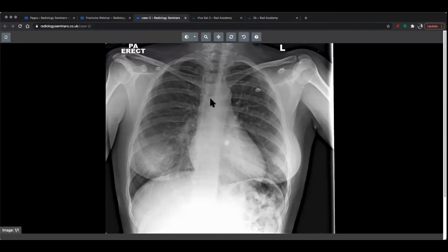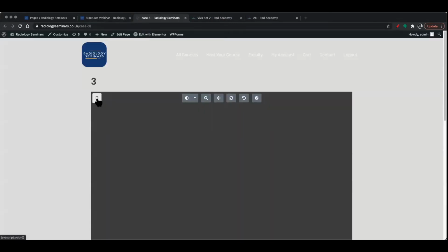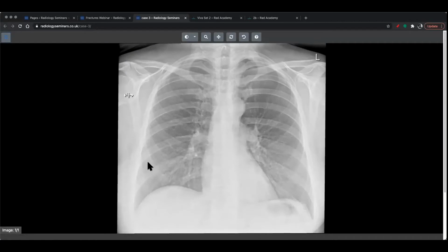So what I'm saying is, the apices, the mediastinum, et cetera, are very, very useful, because even when you've seen the abnormality that you think you've seen, try and look for the next thing, and use the check areas to hopefully spot the thing that could really give you what's really going on in this particular patient. And in this particular patient, it's a destructive bone lesion that is resulting in destruction of the posterior rib over there. Great, good. So yeah, we've got some really switched on people today. So now let's go to case number 3.